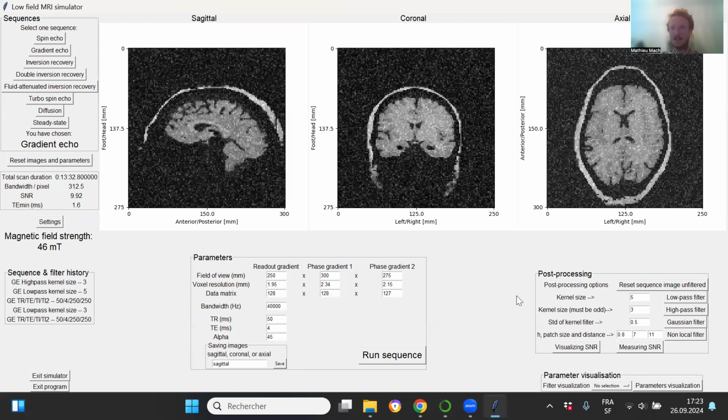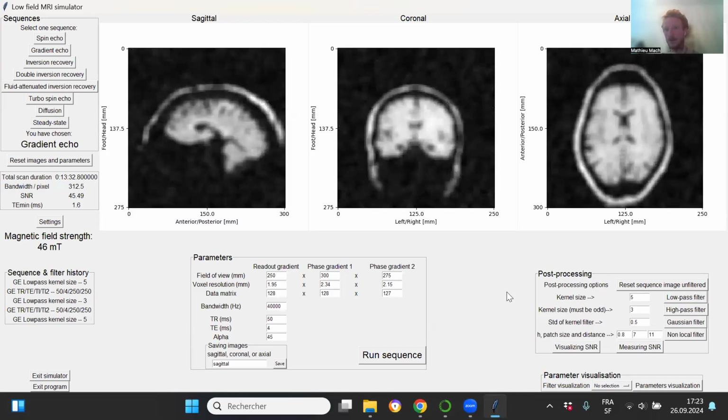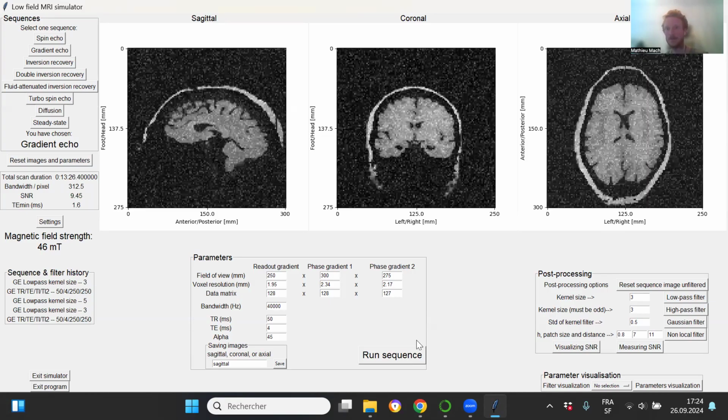And now let's say you're happy with the way the SNR is defined. You apply one of the low pass filters, and you see this image, but you're like, oh wow, it's really big. I wonder what it means to change this number? So let's say before I had 3, and you want to have a little bit more detail into what is happening. So we go back to our gradient. We can rerun a sequence just to get the images from the start.